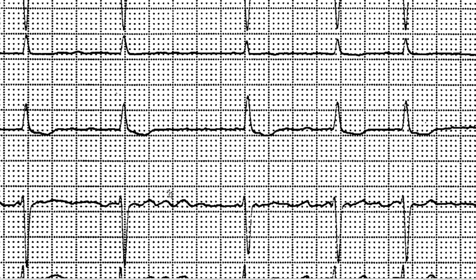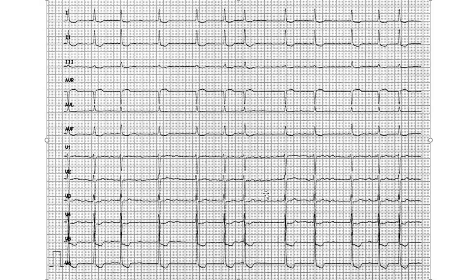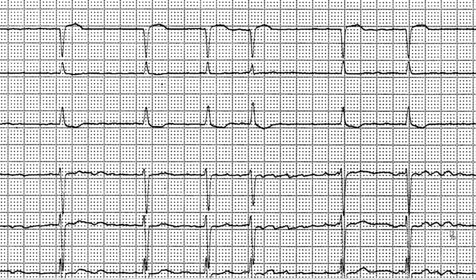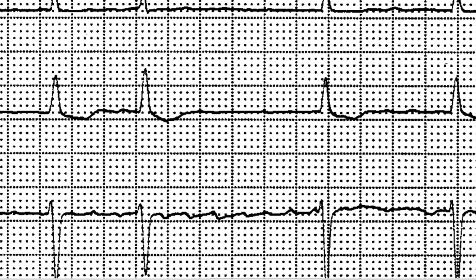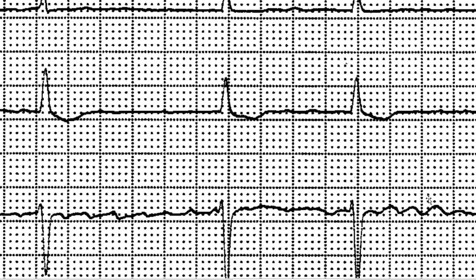1, 2, 3. About 3.5 or something like that. I don't know what to tell you guys. But yeah, oh, there. That's a good place right there. Keep going. Yes. Okay, there we go. So 1, 2, 3. That is roughly going to be 3.